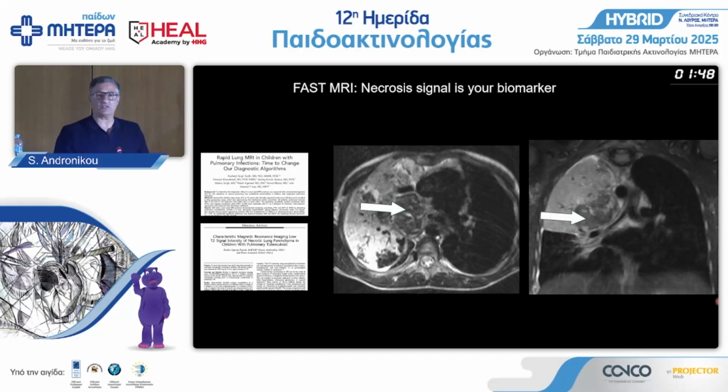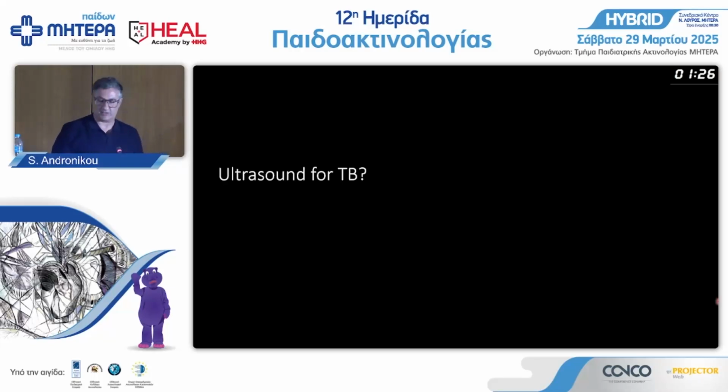And it's the same necrosis that's happening for TB granuloma in the brain. If you have a look at all the papers, if you want to make a distinction of TB granuloma from an abscess, on T2, the TB granuloma is black, the abscess is bright, okay? So MRI detection without anesthesia and characterization is like a biomarker. You can't really be anything else, okay? Except for calcified nodes, I guess.